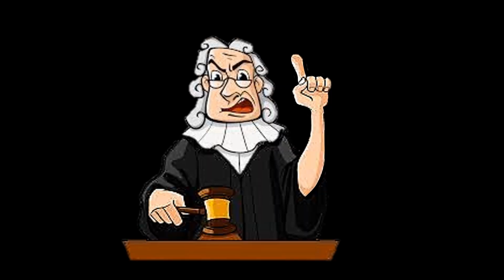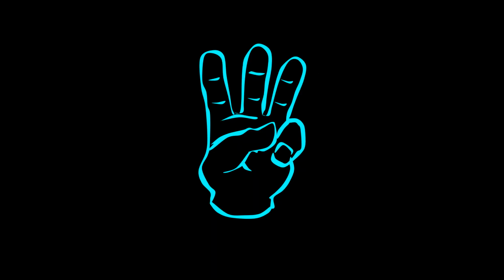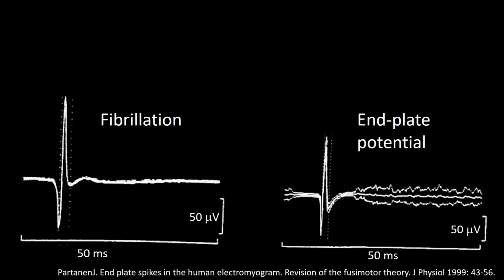Now that this is decided, let's look at the 3 findings in the figure present in this question that help us distinguish fibrillation potentials from end plate potentials. One is that the intervals between the initial baseline departure and maximal negativity last longer in fibrillation potentials than in end plate potentials. If we draw a broken line delineating the interval between the baseline departure and the negative peak, as you see in this frame, we find that the interval in the end plate potential is about 1/4 briefer than in the fibrillation potential.